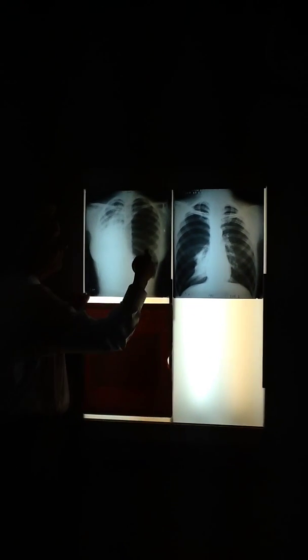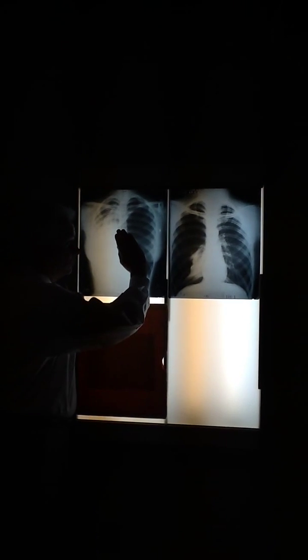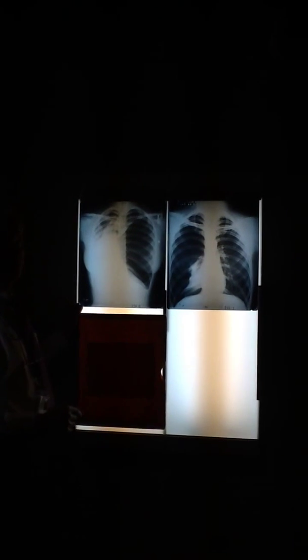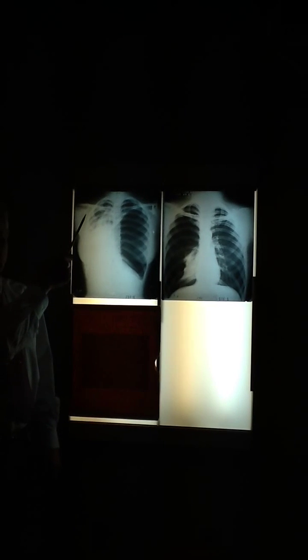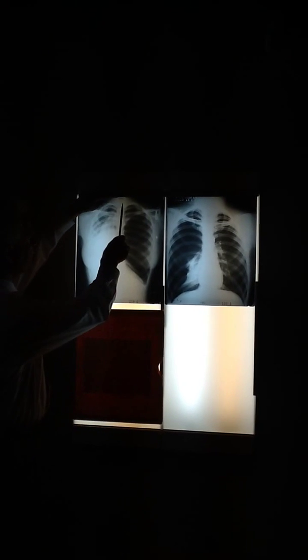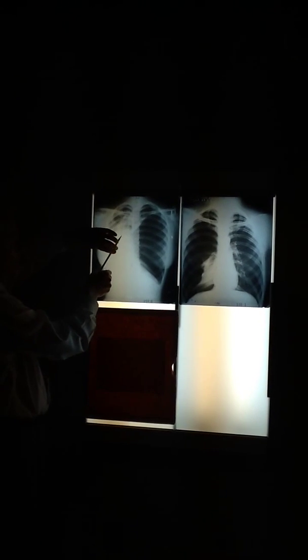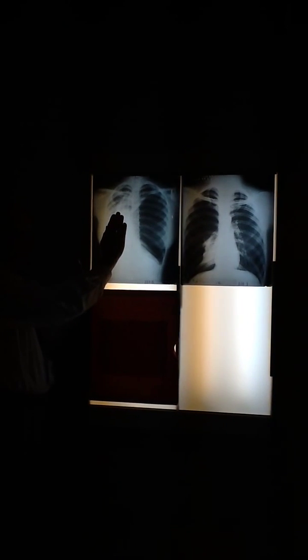Because this is the left lung, notice, hyperlucent, no visible vasculature. We also have no what over here? No heart. Where's the heart? Well, there's the trachea, being pushed slightly away. It's supposed to be here. You can't move it up here, but the thing's going to move like it's hinged, like this. So the trachea went here. By extension, what else went? The heart. The whole mediastinum has moved, yes. So the heart went all the way over to here.